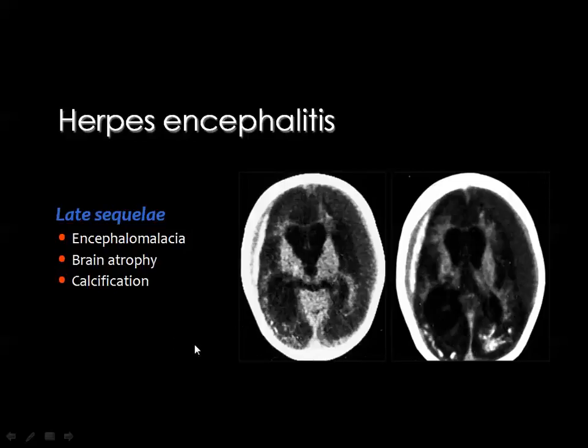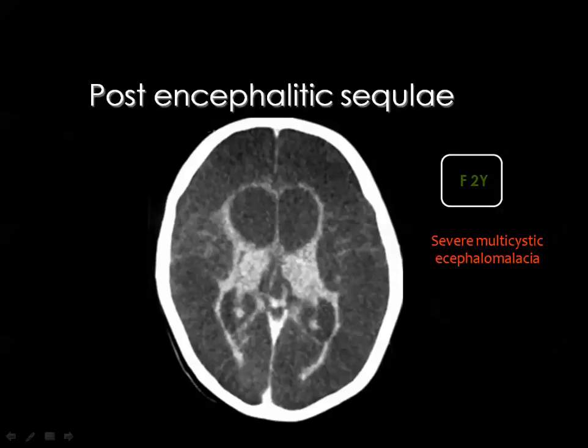In patients with previous viral encephalitis of the brain, the follow-up studies may end with extensive hypodensities within the brain parenchyma, denoting areas of encephalomalacia, extraaxial, usually subdural collections, parenchymal and dural calcifications, and dilatation of the ventricular system, denoting the presence of atrophic changes.